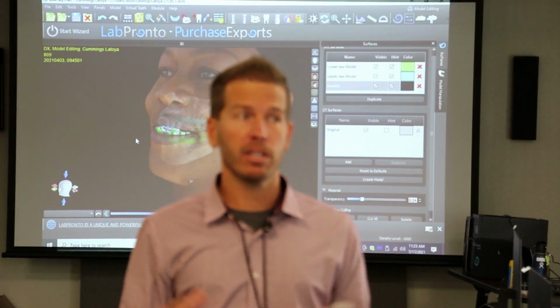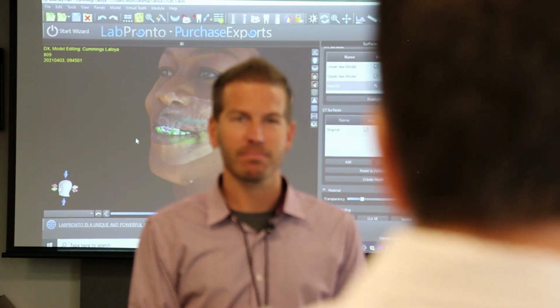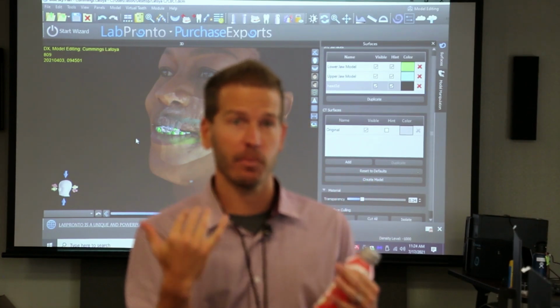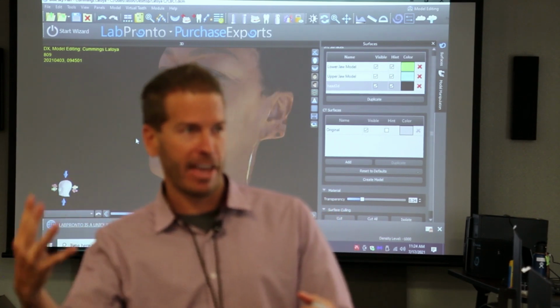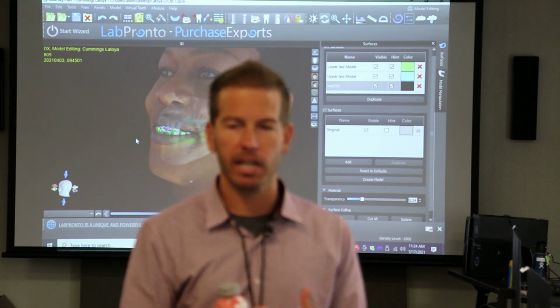Yep. And so this goes hand in hand with that wax up. So if you did a wax up, like if you got somebody with just really shattered teeth and you did a wax up and you had their face in there, it'd make you look pretty high tech to show them all of that and then the after and what you'd like to do for them. So it's just all kind of hand in hand.